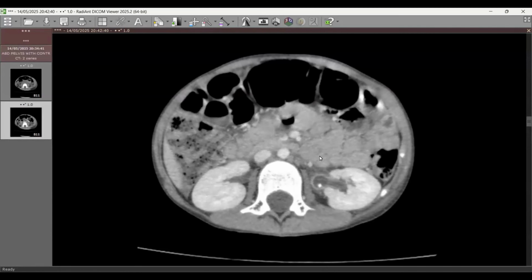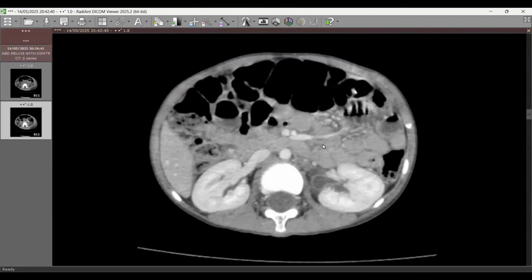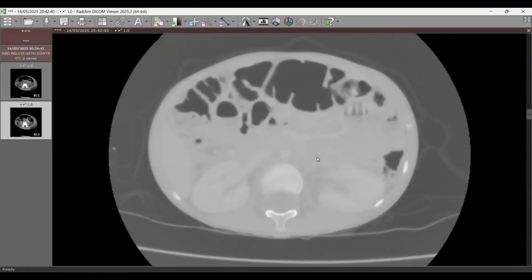Looking at the pancreas. Yeah, the other viscera were fine. Okay. So in summary, I'm suspecting left ureter rupture and urinary bladder rupture. So I immediately convey the finding to the referring physician. In my routine practice, I'll also check the bone window and coronal images.